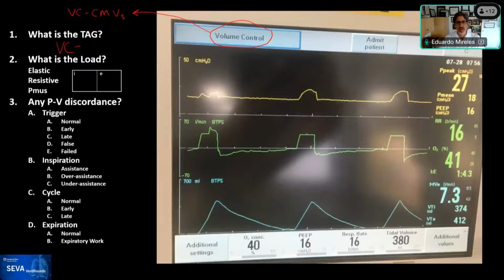However, on breath number 1, you get concerned because you see now a bump that you were not expecting to see. So there is now evidence that the flow is not as it should be. And this is a classic manifestation that there's a different targeting scheme. So something else is happening.